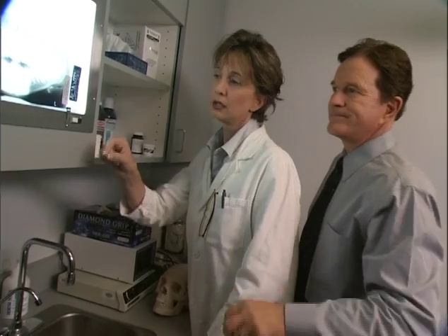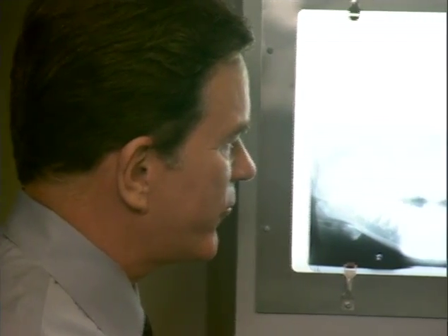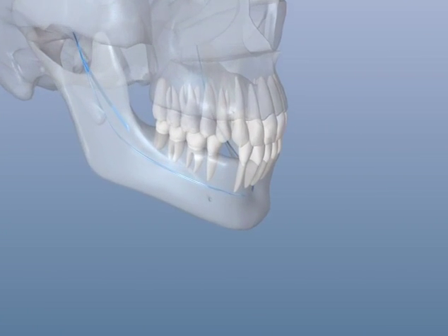Dental implant treatment is a team effort that includes the patient's oral surgeon, and general or restorative dentist. The oral surgeon performs the actual dental implant surgery, but it's the dentist who, for a separate fee, creates the crowns, the bridges, or the denture that will be later placed over the implants. The professional team frequently interacts, reviewing films, determining the number and position of the proposed implants, and otherwise working together to plan optimum treatment. A single-stage implant has an extension that protrudes slightly above the gums.